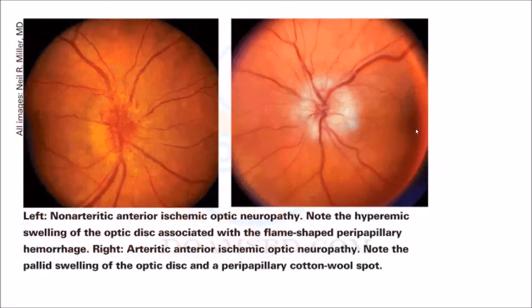In these two pictures, this one was shown before, a relatively similar picture. This is arteritic, but in this picture the white areas are not visible like there. So this is reddish rather. So this is non-arteritic anterior ischemic optic neuropathy. Non-arteritic means maybe vascular occlusion is there, hyperlipidemia and other consequences, maybe thromboembolic. So both are optic neuropathy.